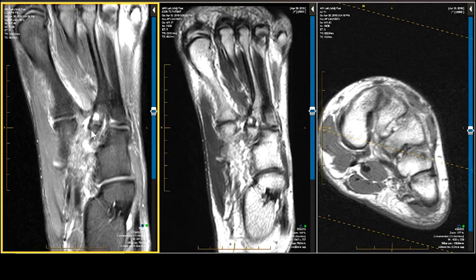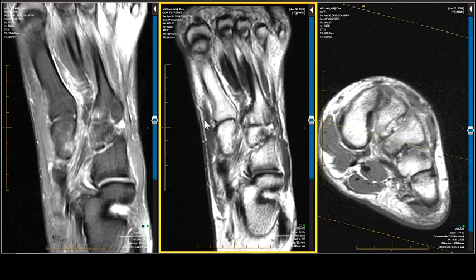So at the very least, I would say isolated form of Lisfranc ligament injury / rupture. I'd use the rupture word, or I'd use the tear word, with involvement of the plantar Lisfranc complex, including at least C1 cuneiform to M2 base of second ligament, and possibly C1M3.